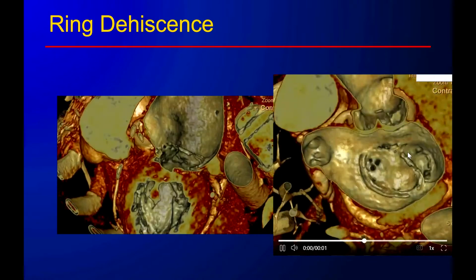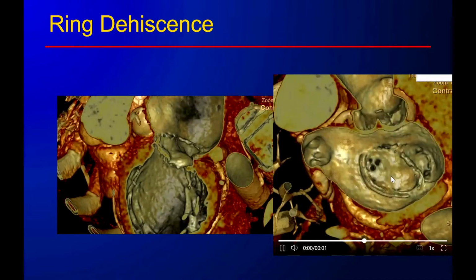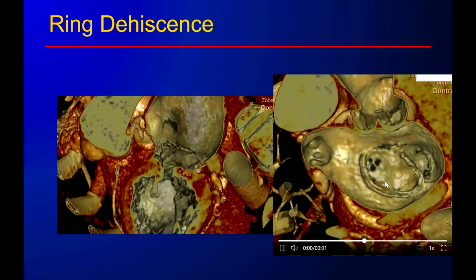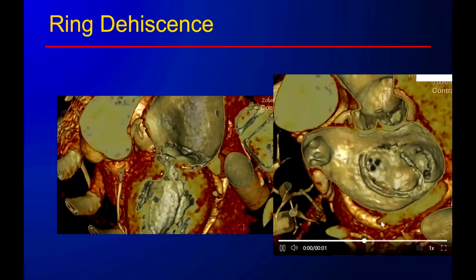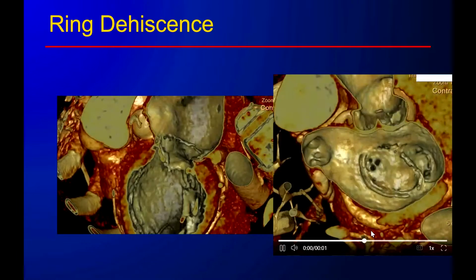And the question is, should we close this gap? And the question is whether, even if you close this gap, the MR is still coming out from here. It doesn't really solve the problem. Is that making sense? And Dr. Little often tried to make the concept clear for you guys to understand the reason why.